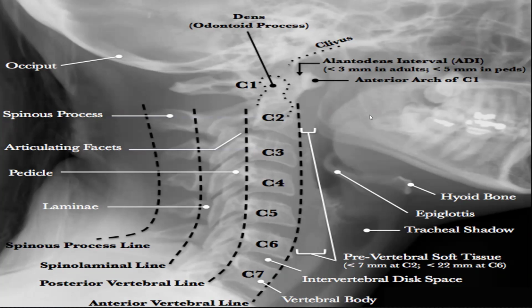So how do I know the fracture? Give me examples, doctor. For example, what are the common fractures and how do I diagnose them? Common fractures could be a wedge fracture. How do I see that? On the anterior border, you will find the height is short.